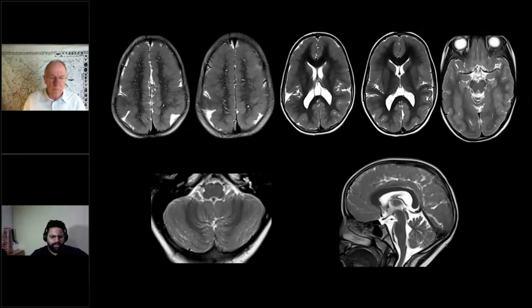So here we have the MR images, the T2 axial images on top, and I can appreciate that the bilateral frontoparietal regions are severely malformed. This is demonstrating a cobblestone type malformation. Almost the entire cerebral hemisphere cortex is abnormal. There's a slight abnormality of the ventricles. The basal ganglia and thalamus demonstrate normal appearance. There are some subcortical hyperintensities. These linear hyperintensities are adjacent to the cortical malformation.